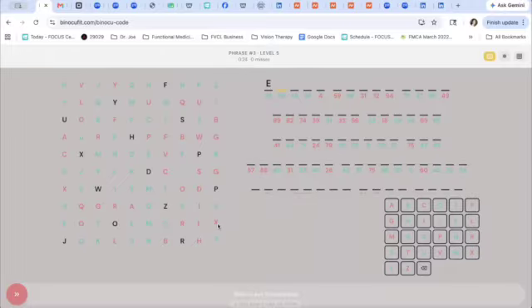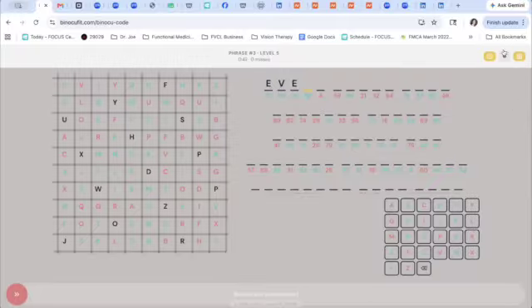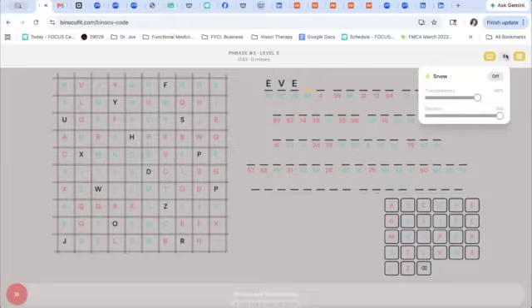Okay. And number 80 is going to be V. I can either type it on my keyboard, or if I'm on an iPad, I can use this over here. So 46 is another E. I'm going to tap it over here. Okay. So I have to go back and forth. And again, we have access to the stability grid on this side. I just put those thick lines there, and I also have the ability to turn that snow on.